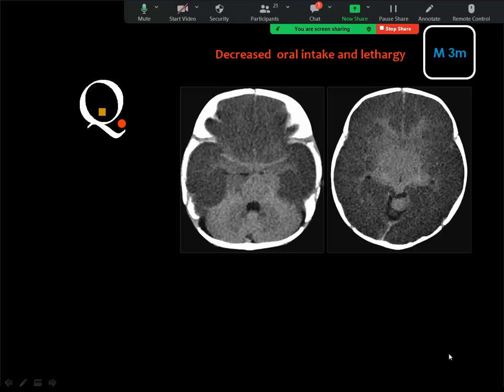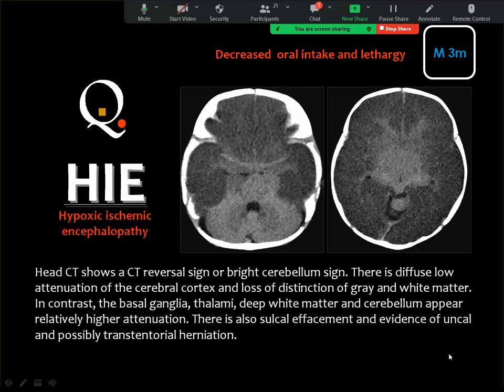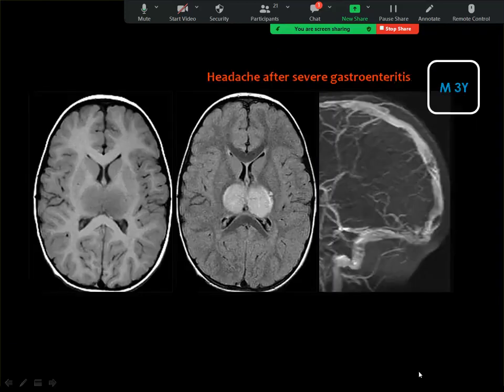as hypoxic ischemic encephalopathy, and a lot of reasons can cause this, and this is a serious disease where you got ischemic changes of most of the brain tissue. This is known as global ischemia.